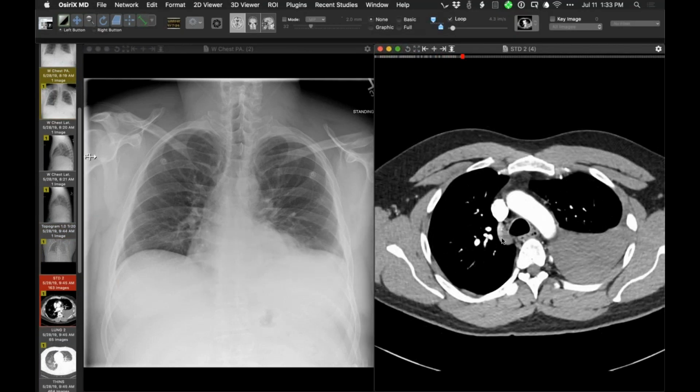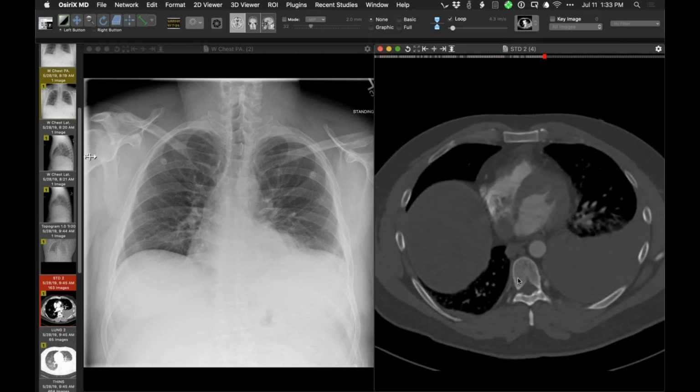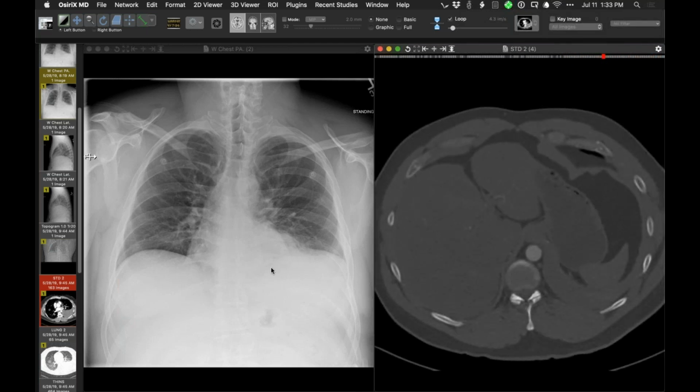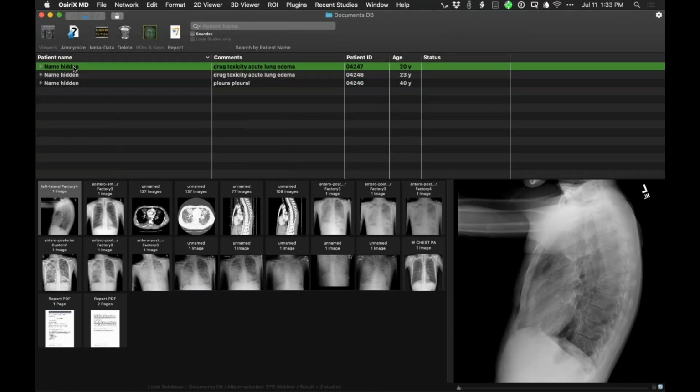And it turned out to be associated with a fracture, and that is the left hemothorax. Here is a displaced fracture down there. So a really nice example of remembering the idea that one can diagnose left subpulmonic pleural fluid sometimes by looking at the stomach and being aware of where the diaphragm is and the base of lung is. So these are two really nice cases. So let me first show you the more severe one.